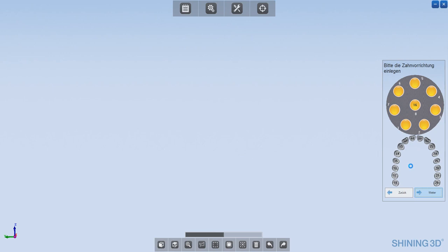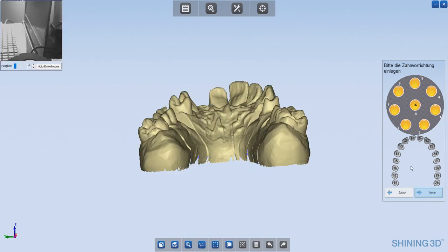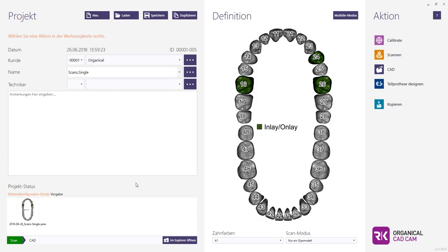So then he asked me to put the first stump in the position number 1. And 1,6 is... Yeah. 1,6 is this side, so I'm sorry, I just made it wrong. I put this one in this position.